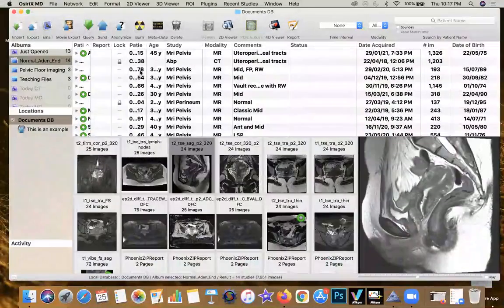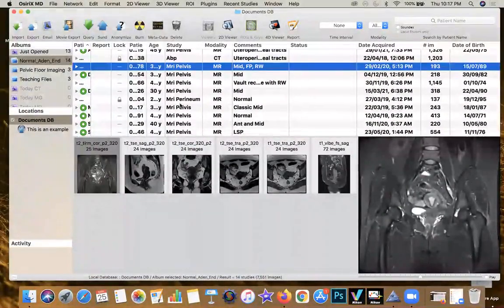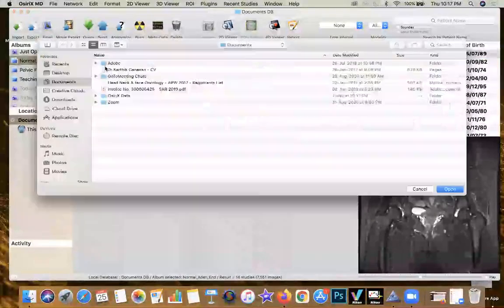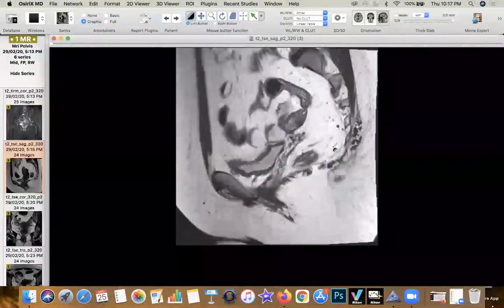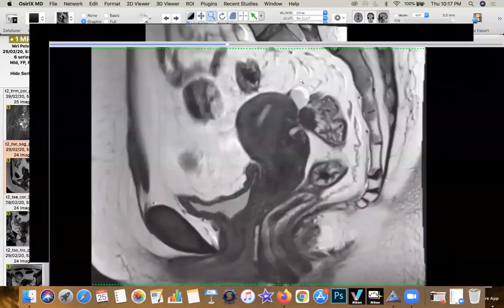So with this, I've shown you the entire battery of presentations. Let me see if I can get you all one more case. So probably there's just not enough time. I'll just refresh this with one classic case for you all to show, to complete the entire spectrum.